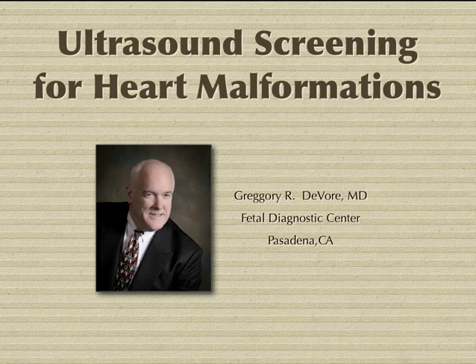As you are aware, the detection of congenital heart defects is one of the most difficult tasks for the fetal sonologist. This is one of a series of case studies in which I will review the images from a fetus with congenital heart disease. The purpose of this media program is to present a real-world situation in which the diagnosis was made and the fetus was not at risk for congenital heart disease.